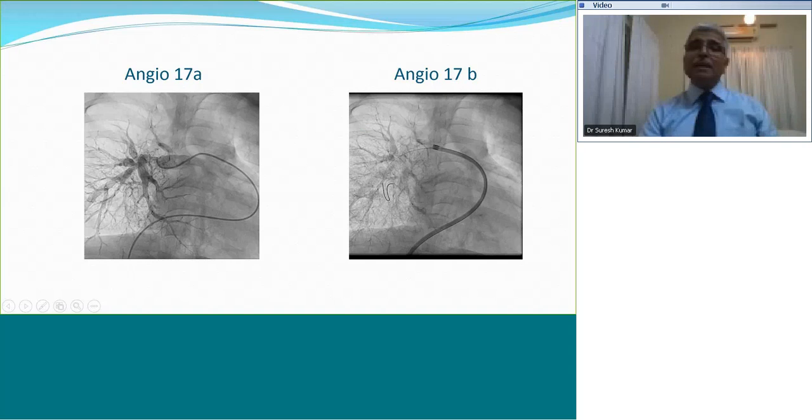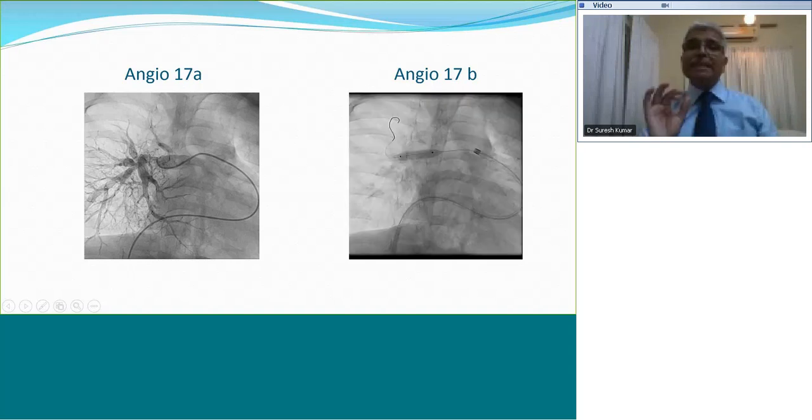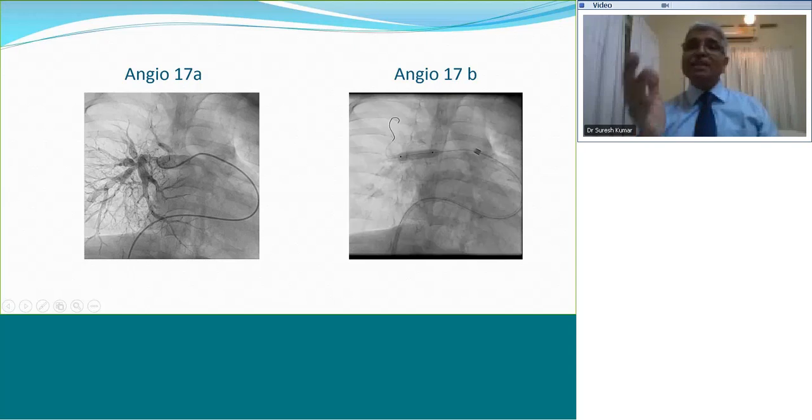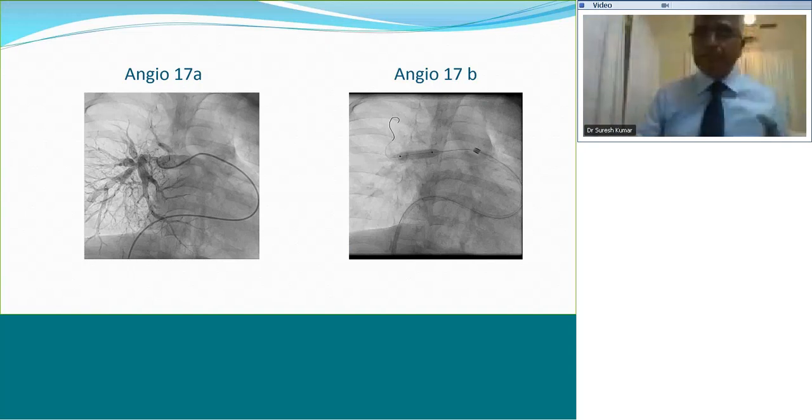I'm happy if you say it is cutting balloon, because if the transmission is good, you can see the margins of the blade in that. That is why initially somebody thought it is a stent. This is a type of situation that you find in conditions like Williams syndrome, and regular balloon dilatation, they do not respond, and it's a cutting balloon that they usually need. And you must have some general idea about cutting balloons.